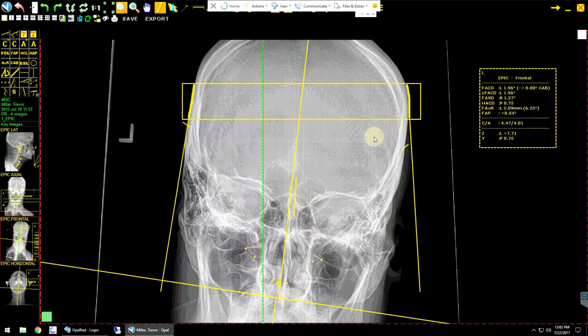And the reason being is all about frame of reference, right? So we're trying to stay above the suture lines, right? But because the head is tilted, and we don't want to remove that tilt because that's part of the whole process for Grostic, we're getting really close to the suture line here, but over here there's a big gap. So instead of being able to tilt the tool and actually stay along that line so that you're actually measuring the same area left to right, something like this.